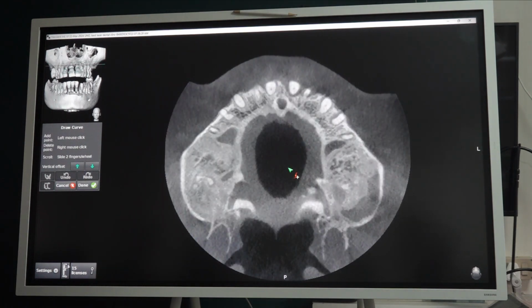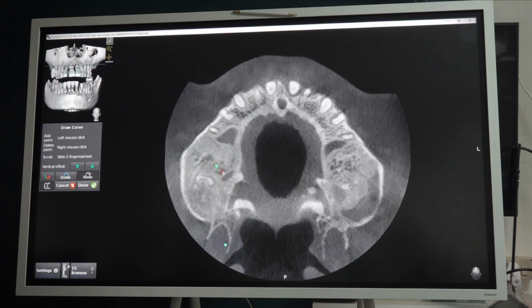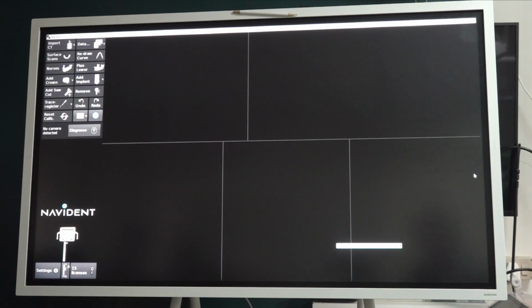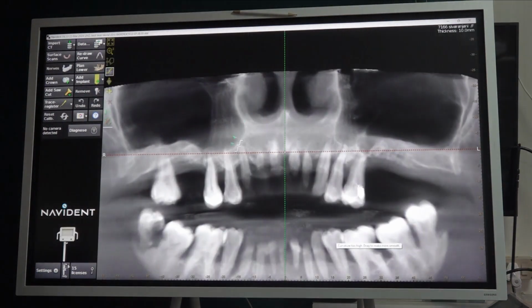This is near the crest. This is near the crest. There is bone, but it is not sufficient. It is only 3 mm height. Now you will see that. So if you see this view, you may get fooled. You may think there is good bone. But actually, it's not so. So this shows the challenge in this situation.